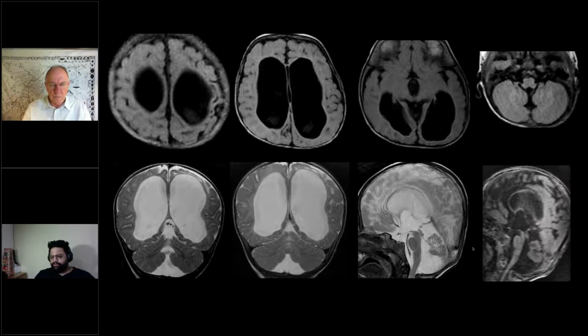I think we'll follow up the baby for development, whether it's behaving like a one-time injury versus any progression. At least on the imaging, I wouldn't think it's related to congenital muscular dystrophy because many features are absent. And also the presence of the stenosis, if it's chronically progressive or acute hydrocephalus, the injuries are most likely sequelae of an acquired injury, especially in the left periventricular region. The cerebellum also might have been affected. So that is pretty uncertain. Yeah, I would agree.